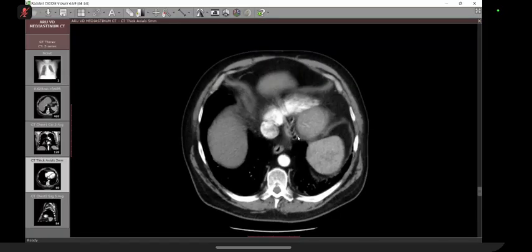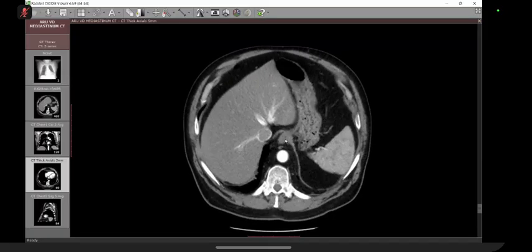Please remember, this area is very tricky on a CT scan, the gastroesophageal junction, and it is very easy to overcall things because if there is a bit of a hiatus hernia, you can call it a tumor and things like that. So please remember, you will tell us that there is a carcinoma, then we will do a CT, right? So you have to diagnose it and we tell you that this is the staging. Don't go home with the idea that you can pick up a tumor there.